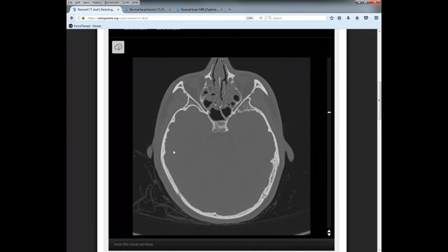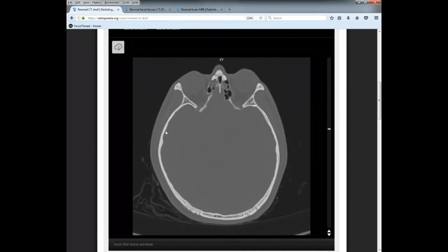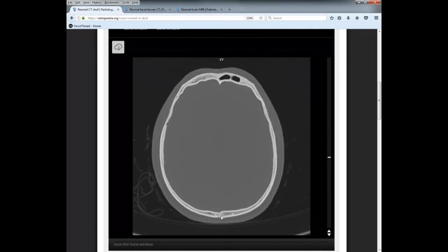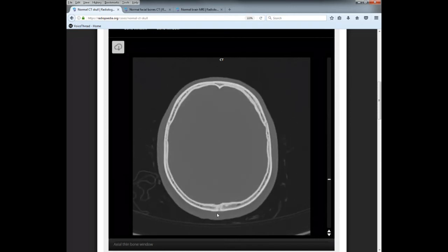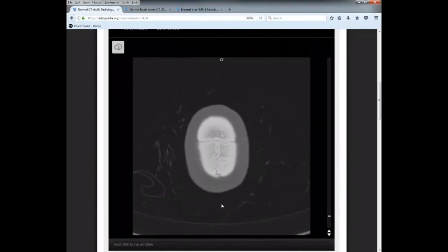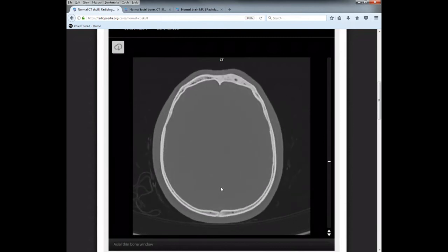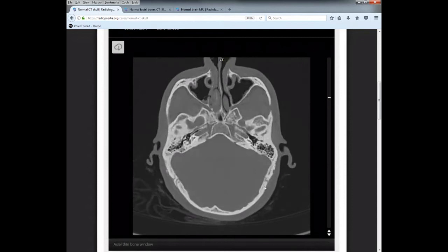Squamous, which joins the temporal bone with the parietal, is the hardest one to see when you go all the way up. It's kind of coming in here. You can kind of see it a little bit here. Definitely you can see the sagittal suture. Definitely when we go all the way to the top, you can see the coronal suture running transverse, and then the sagittal. And then the lambdoidal in the back, for sure, separating the parietal and the occipital right here.